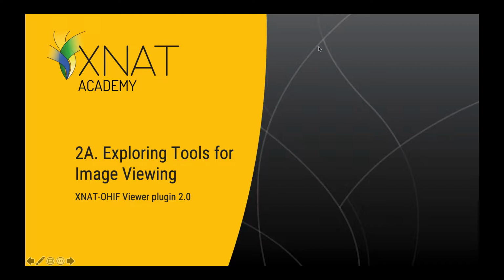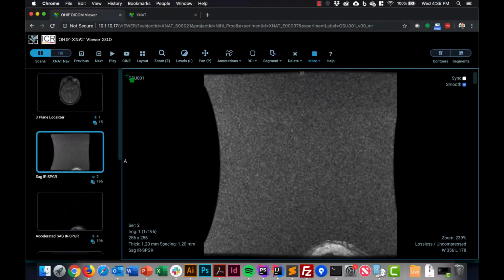Let's talk about some of the tools that are available to us in the viewer while we're viewing scans that go beyond some of the very basics that we showed you in the last lecture. So I have an MR session open in my XNAT right now, and it's got a few things in here that are going to make it easy for us to demonstrate a few of these tools.